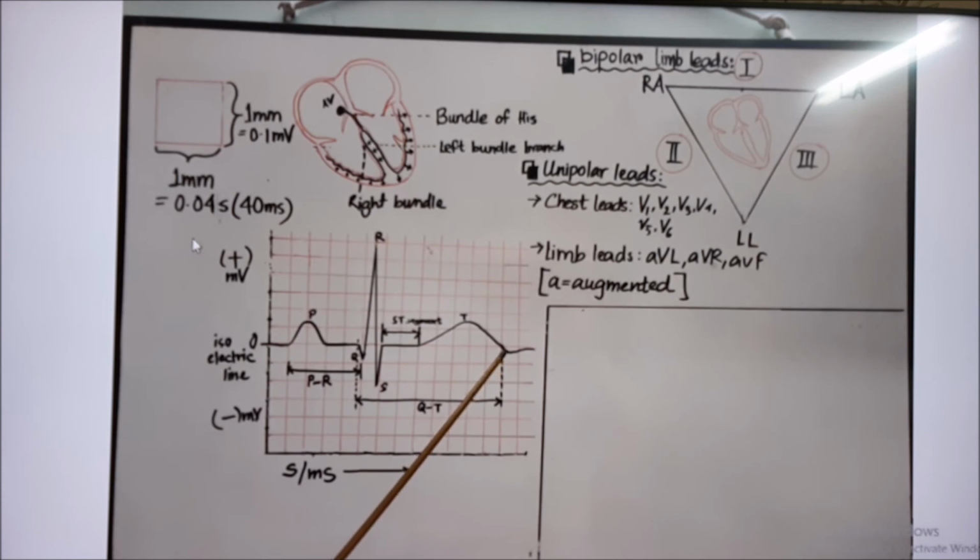When you go to the final year or fifth year, which lead is very important? It is the Q wave, PR interval, then ST segment and T wave. The ST segment usually lies on the isoelectric line, but sometimes it goes upward in elevation or downwards in some leads, not in all leads, but usually it is on the isoelectric line. I think you understand.